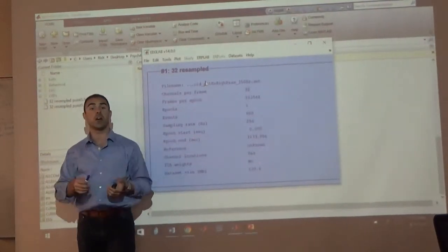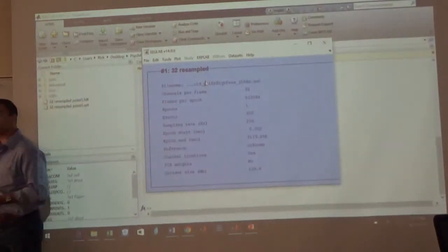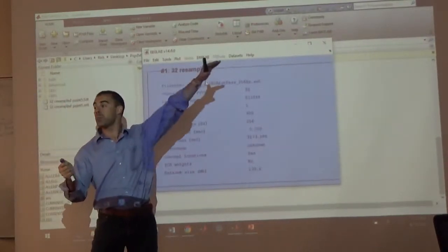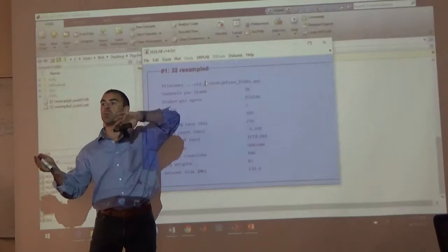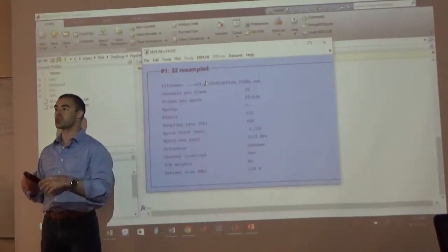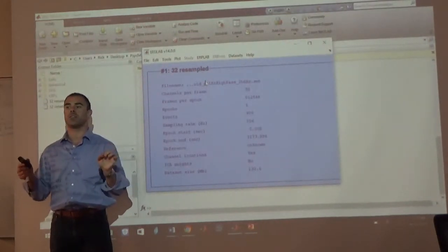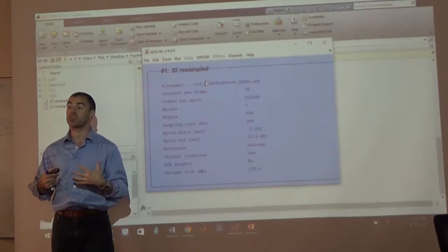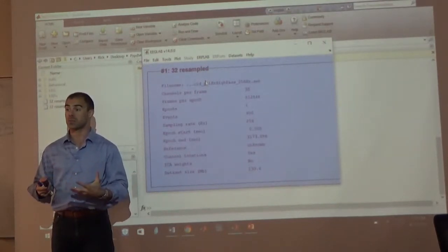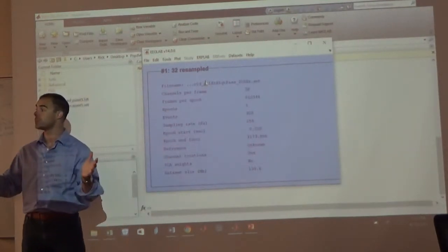So we're going through all these steps because, at least some of the early ones, we know that there's artifacts in the data, right? We know that there's drift from a long period of recording, right? So we apply our high-pass filter, right? We did these things because we're trying to get the data in the way that we need it in order to make sense of the brain activity to resolve our hypotheses. Okay, so we have to do all these sort of what we call pre-processing steps.